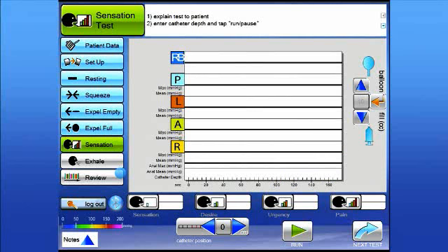It uses the previous test location. In our earlier example test, we used location 0, so it will automatically be located in this position. You will see that the run indicator is already on.